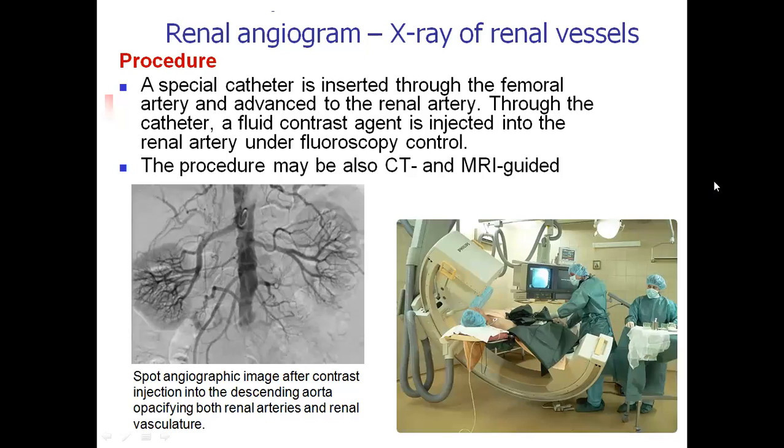Next option of radiological study in urological practice is renal angiogram, or X-ray of renal vessels. During this procedure, a special catheter is inserted through the femoral artery and advanced to the renal artery under fluoroscopic control.